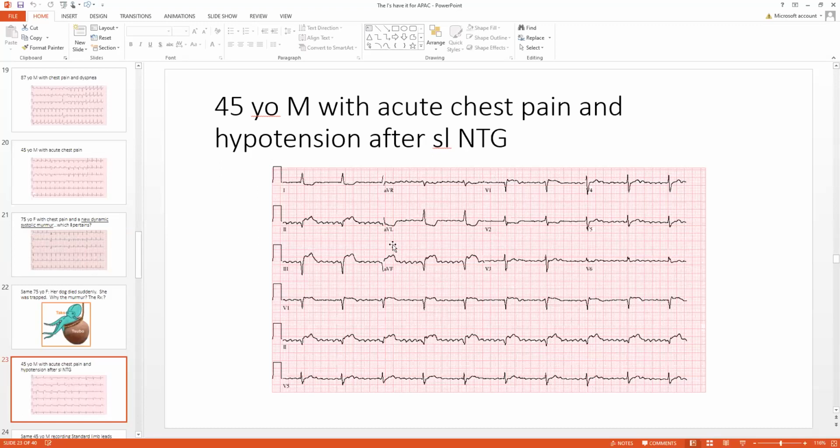Well, when this electrocardiogram was brought to the emergency room where the patient was seen next, the patient was worse. When the patient received the sublingual nitroglycerin, there was almost instant hypotension and lots of room temperature saline was administered, 2 liters worth, and the patient started to tremble.